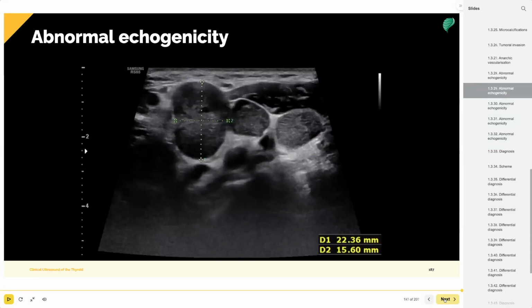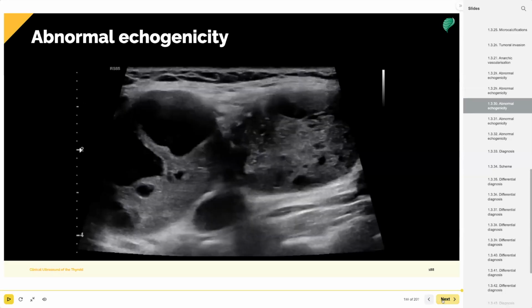Another sign of abnormal echogenicity: you can see that the hilum is not clearly seen and the lobe is actually taller than wide, which is not a good sign. Also here, you can see many cystic regions within the lymph node. It is no longer a simple ovoid structure with an echogenic middle interior region.